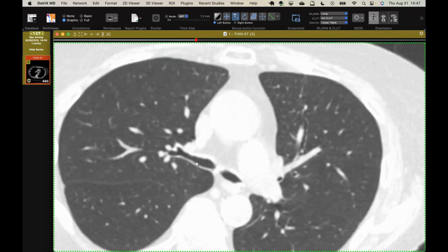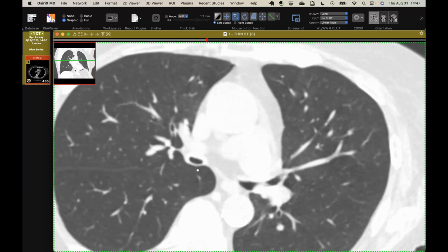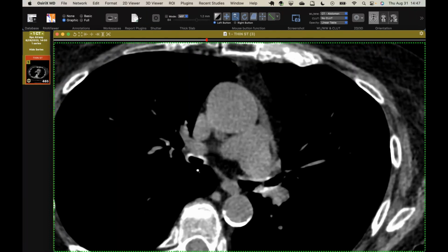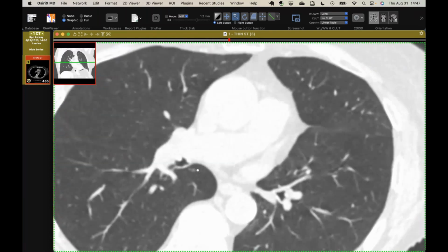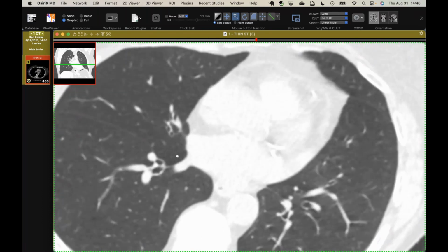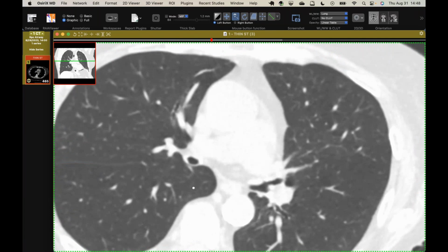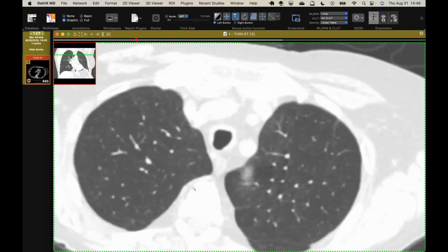This is always my favorite place to look for membrane because it's so thin and you get air on both sides of it. But you can see that the bronchus intermedius is thick and narrowed. The origin of the middle lobe is really tight here. And then this goes out a little bit and then it sort of fades out. That was really the only abnormality, but this is pretty classic for relapsing polychondritis.